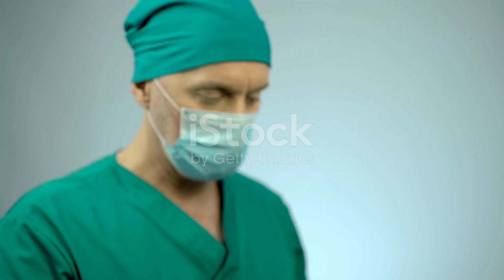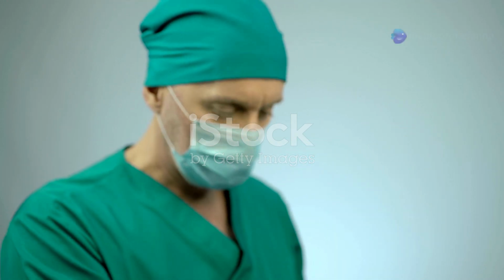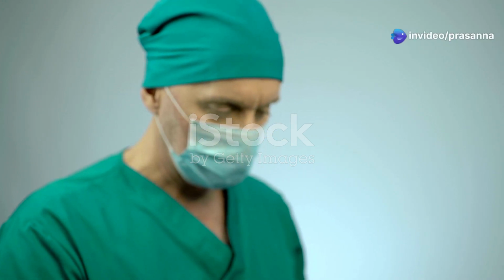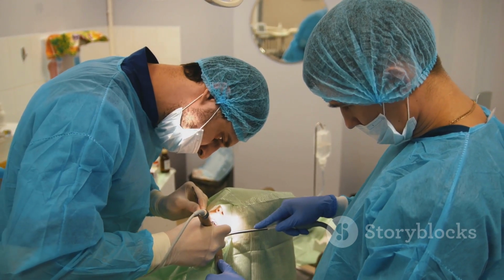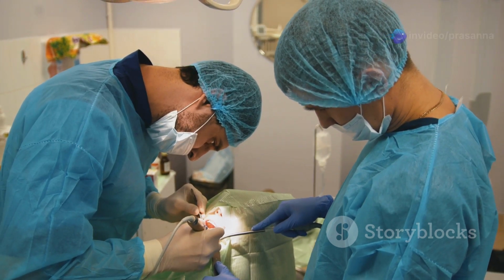The most iconic cutting instrument is undoubtedly the scalpel, a small handheld blade used for making precise incisions. Scalpels can have different blade shapes, such as rounded or pointed, depending on the desired cut. Think of a scalpel as a surgeon's pen, allowing them to draw the lines of an incision with precision.